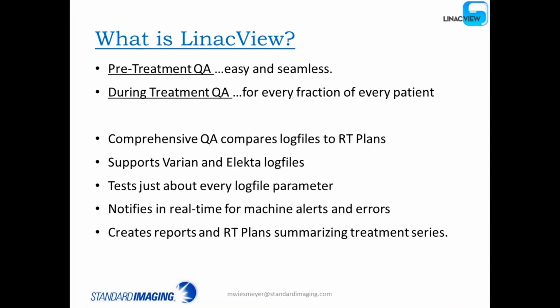LinacView can be used for essentially 2 different things at this point. We have other plans for it in the future. Pre-treatment QA, just like you might use a Mobius 3D system or a MapCheck or something of that sort. You can use LinacView for that as well.